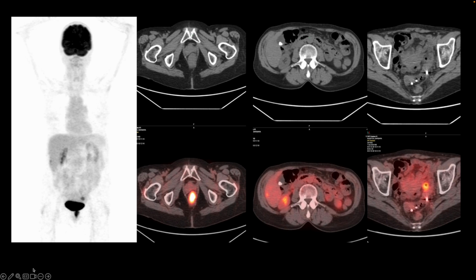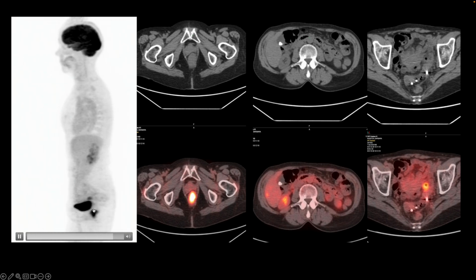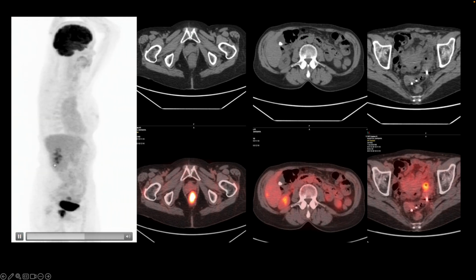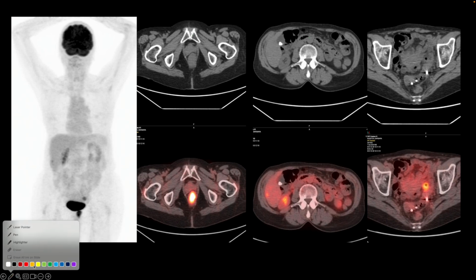This patient was diagnosed with anal cancer, and a FDG PET-CT study was performed for whole body staging. And so you can see the cancer in the anal canal behind and posterior to the urinary bladder physiologic activity. There is a focus in the liver that is suspicious for metastatic disease to the liver. And there is a focus in the pelvis. So let's take a look at all of these three abnormalities on cross-sectional images.